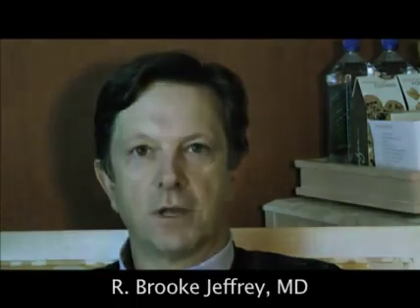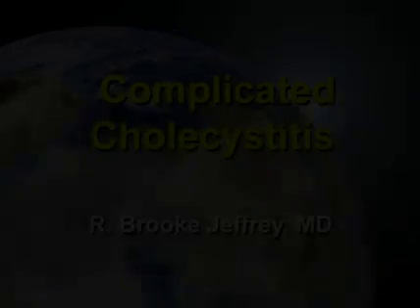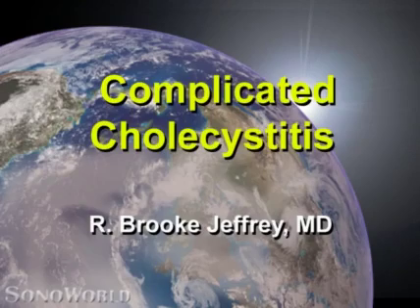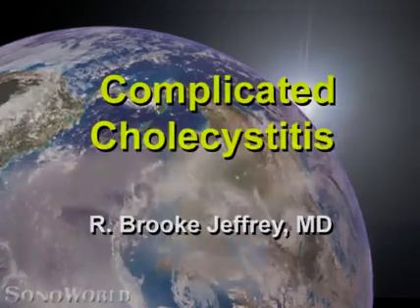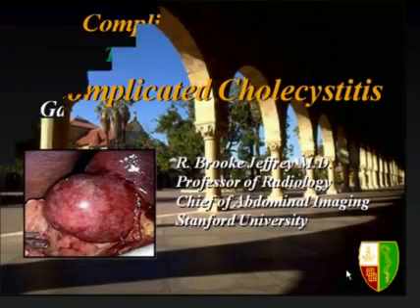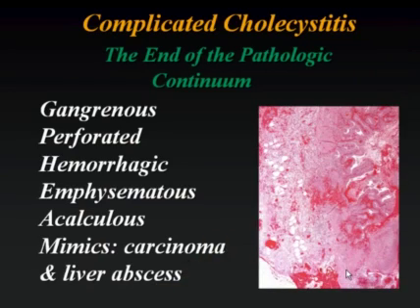And my topic today is complicated cholecystitis, and let's begin by defining that term. This is a series of entities, really, that are at the end of the pathologic continuum of acute cholecystitis.